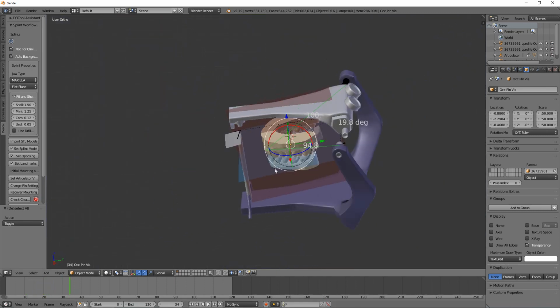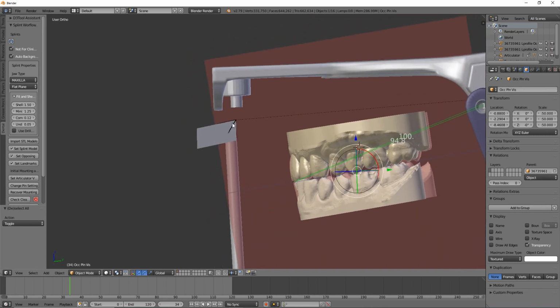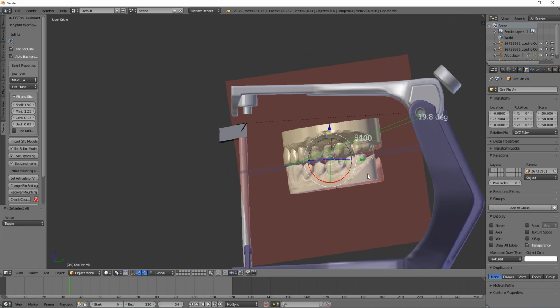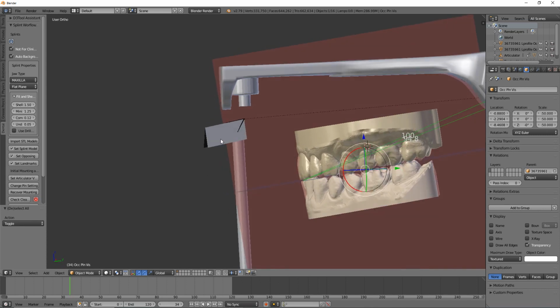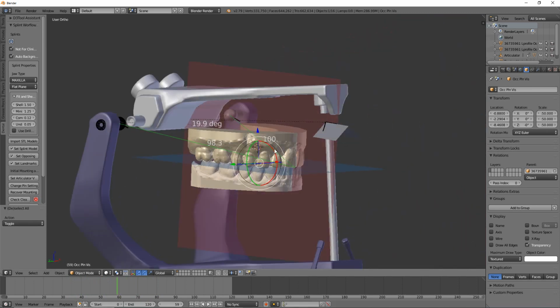The second improvement in the simulation is that with the armature, we were doing a simple linear raycast to find the collision with the guide table. And that's fine for small angles, but once you get to steeper angles, it's not really a straight raycast. It should have been a curved path, or an intersection of a circle with this plane, to actually derotate around the new rotational axis. And so at larger incisal angles, the collisions that are happening on the guide table are now perfect.